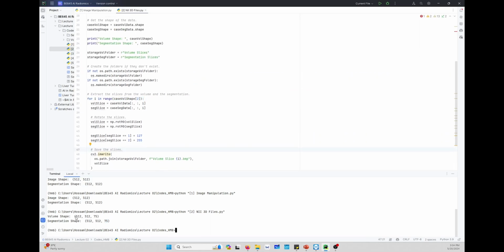Simply, as you see here, we have three values and the index in Python starts with 0. So we need to get the number. By knowing the shape, we can access that number by getting index 2.